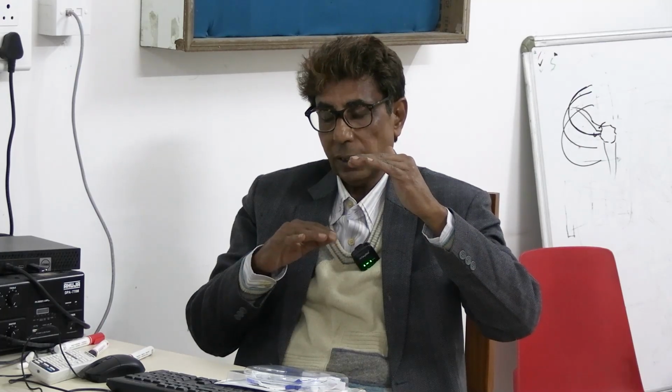The subclavian vein runs between the inferior surface of the clavicle and the superior surface of the first rib, at the junction in the medial third of the clavicle. The choice is the infraclavicular side.